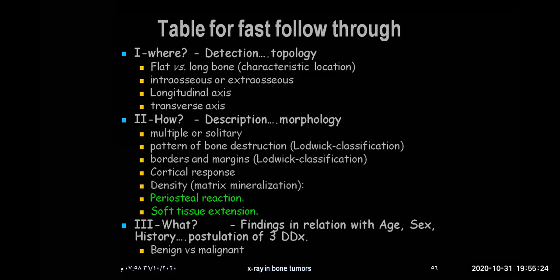What is the tumor doing to the bone, and the response of the bone to the tumor. Then we go to the cortex, and now the periosteal reaction and soft tissue extension.